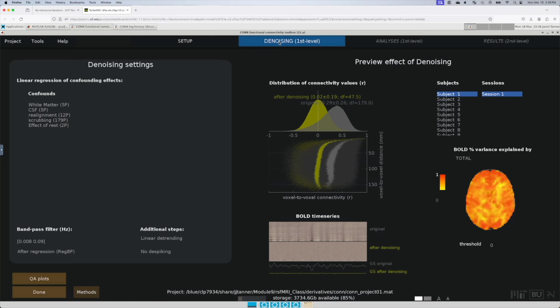And that noise comes not just from being in the scanner, meaning literally noisy, but that's not really what we're talking about. In this case, we're tracking hemoglobin in the brain and looking at changes in the oxygen level of hemoglobin, and that's a really small signal.